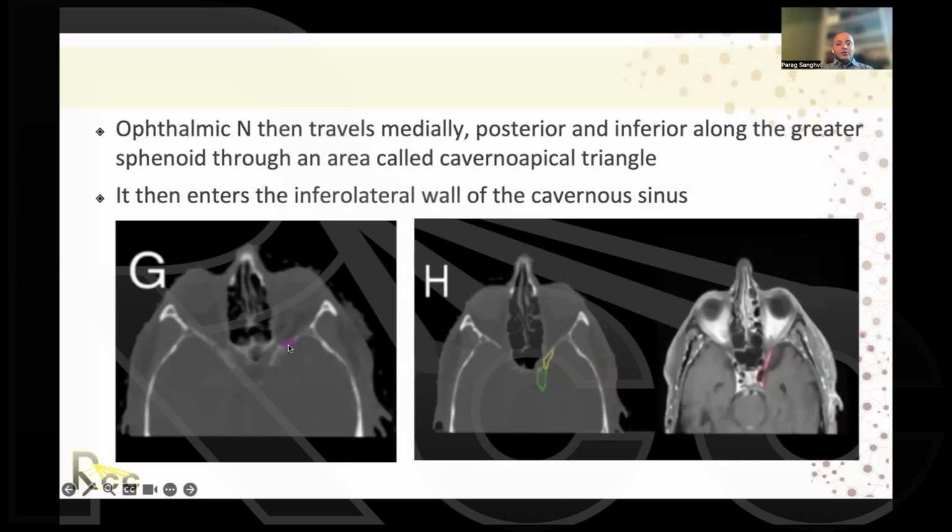And then once you get to the superior orbital fissure, now you're going to contour posteriorly going into the cavernous sinus. And again, you can see why an MRI is so helpful for you to be able to do that. But if you don't have an MRI, just go along the bone windows and just contour right lateral to the sella, and you'll be adequately covering that area here.